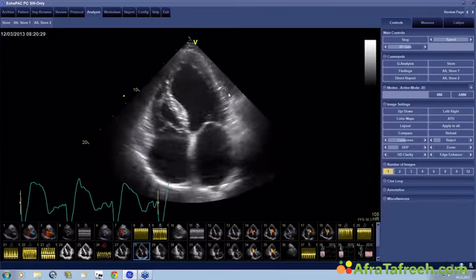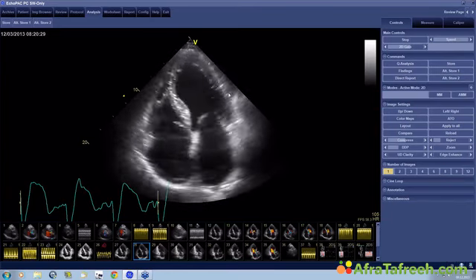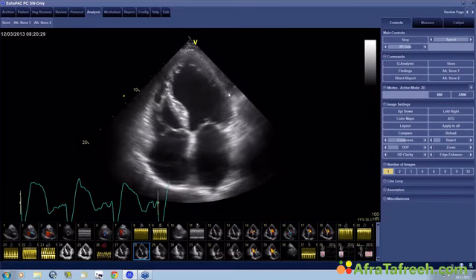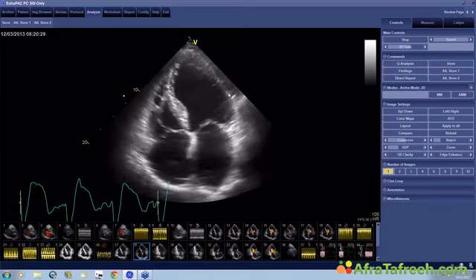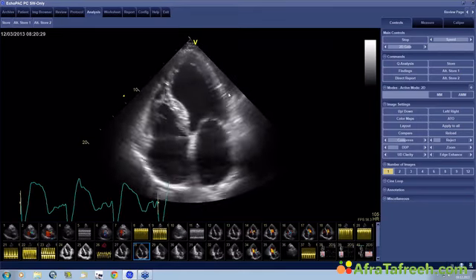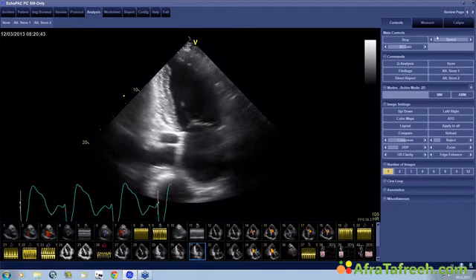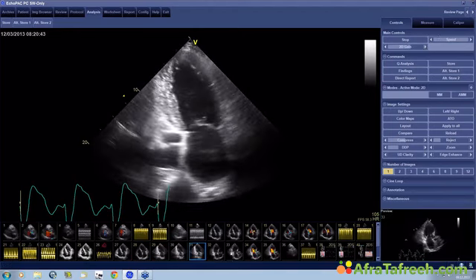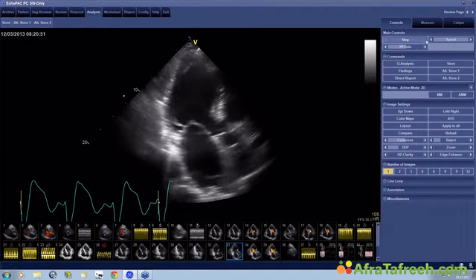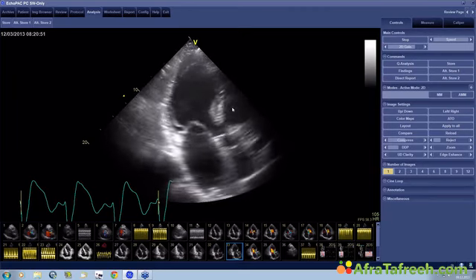So the thought was that there is a number of so-called non-responders, somewhere in the range of 30%, and maybe echo is able to really delineate which patients benefit and which don't. A lot of different parameters have been tested, and the studies have actually shown that echo does not really help in determining which patients are candidates and which are not.